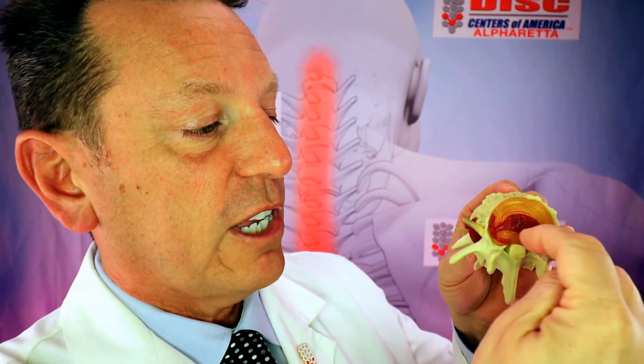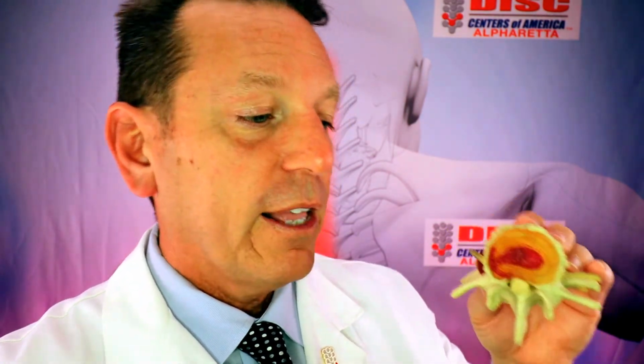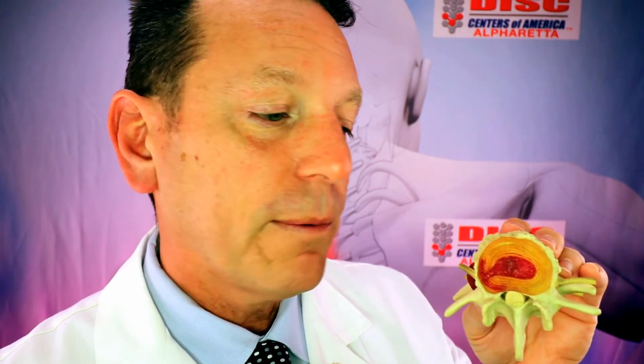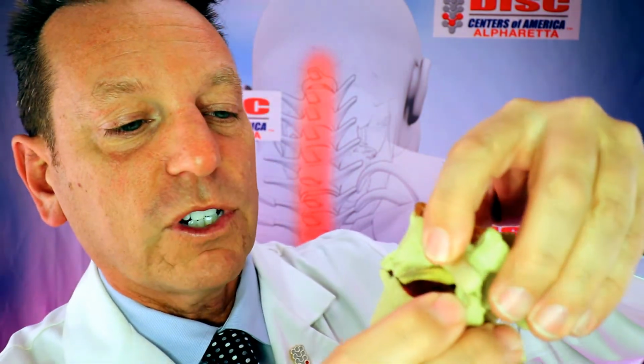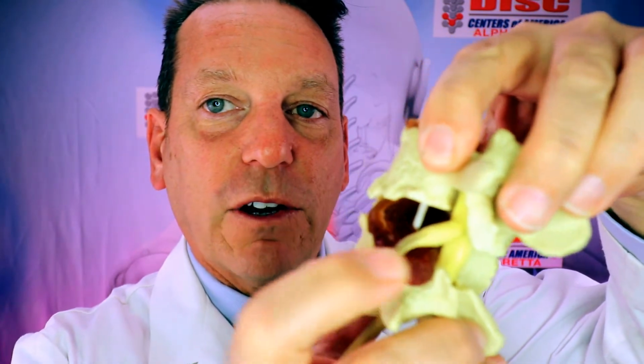What you're seeing right here is what's considered a disc bulge with annular tears to them. That means that the inner nucleus or jelly is not pushing all the way out. So if you hear the term disc bulge, that's usually what they're talking about. I'll show you on another model what that looks like in a second as well. If the disc continues to be diseased where that inner jelly pushes all the way out, that's more of what you're seeing right there. That's going to be called a herniation of a disc, without getting too complicated about it. I'll show you on this other model because it's a great model to show this as well.